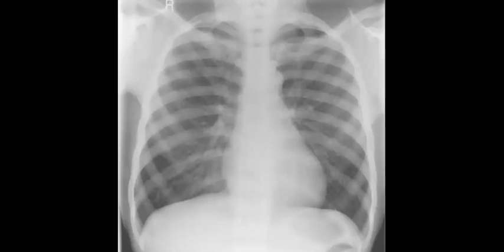So metastases from what? Maybe breast cancer, maybe prostate cancer, maybe. Okay, then if you consider metastases, you will search for anything else like lung nodules. Yeah.